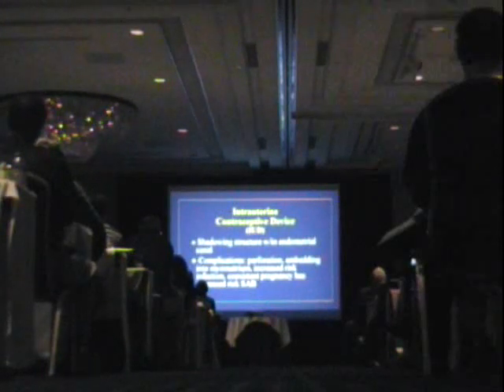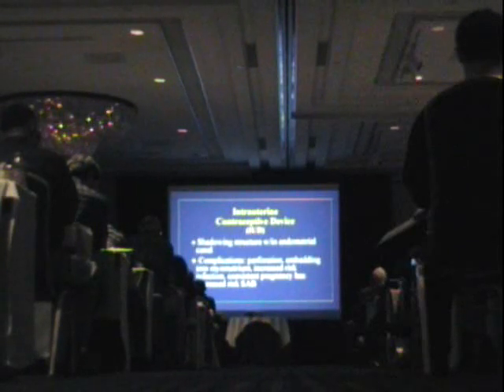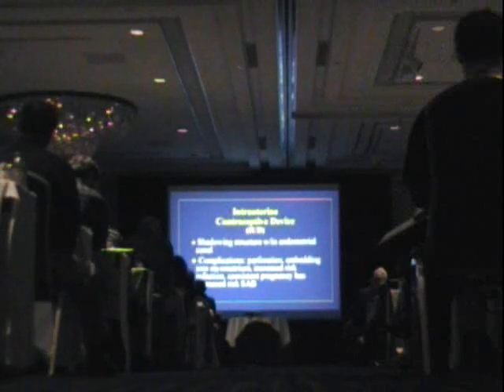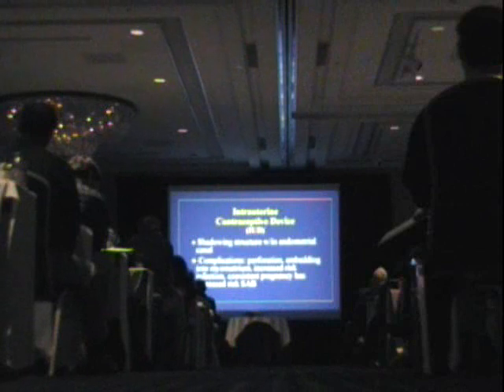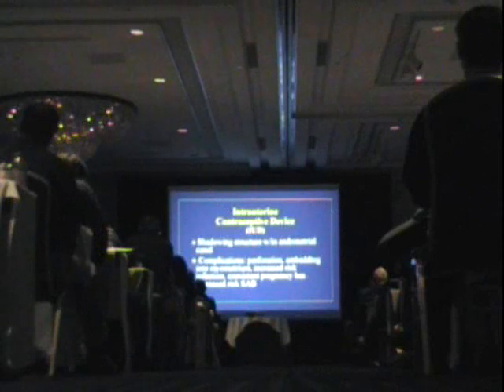A few words on IUDs. These have, in the past anyway, been very, very densely shadowing structures which we see in the endometrial canal. Some of the risks patients face when they have IUDs placed include the risk of perforation. The IUD can work its way or embed itself into the myometrium. Patients with IUDs are at increased risk for infection, particularly the infection that occurs with foreign bodies, so actinomycosis.